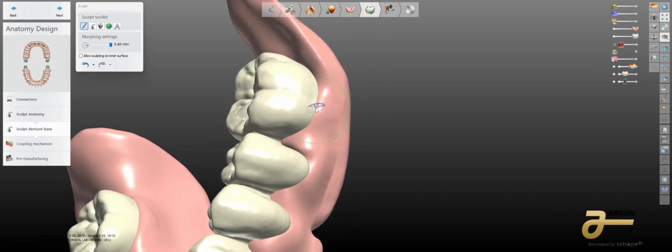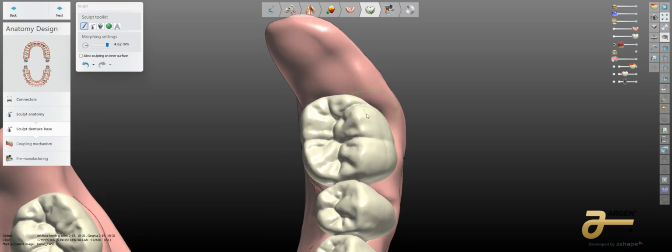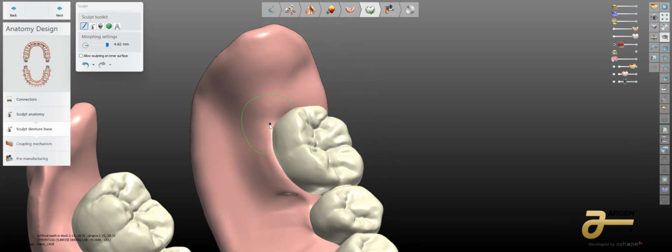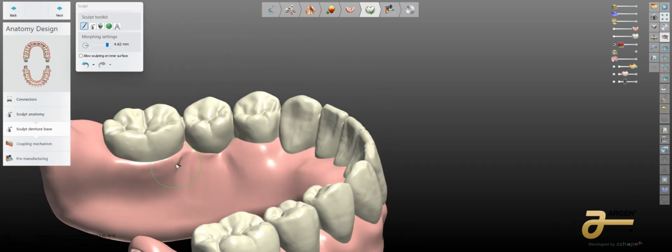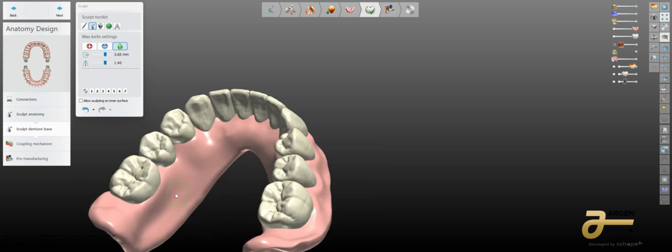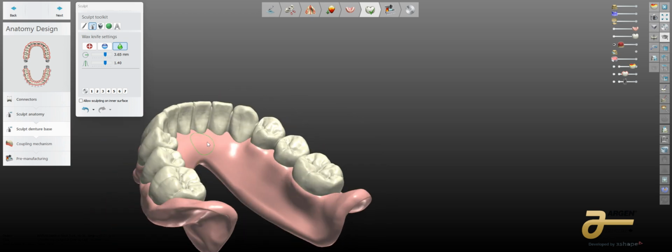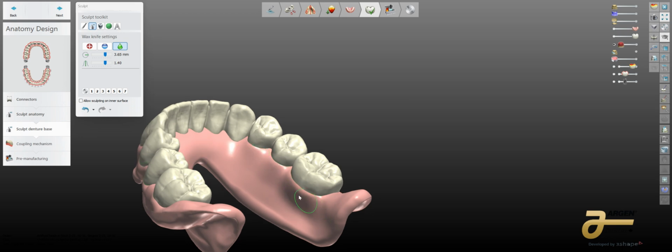Terminal borders here. Want to make sure that as it goes into a protrusive, it's not going to ramp up on the retromolar pad on the extension to the flange. Again, on a perfect demo study model case like this, it's a rarity for that to happen.